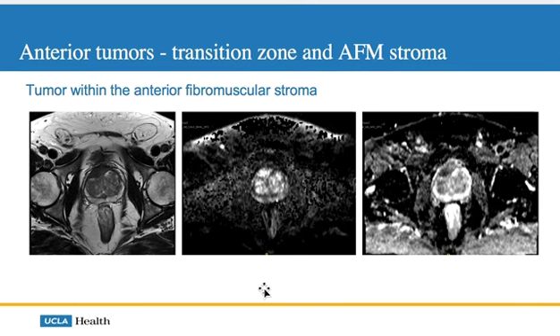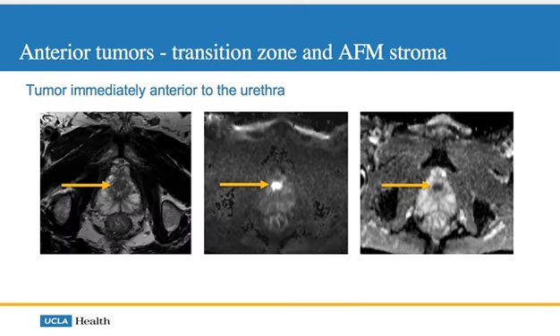This ended up being graded as a PI-RADS 5, and a biopsy of this showed relatively high volume Gleason 3+4 prostate cancer. So that's an example of a tumor in the anterior zone of the prostate that, in this case, is relatively easy to see, but these things can be difficult to see. So here's another interesting example.